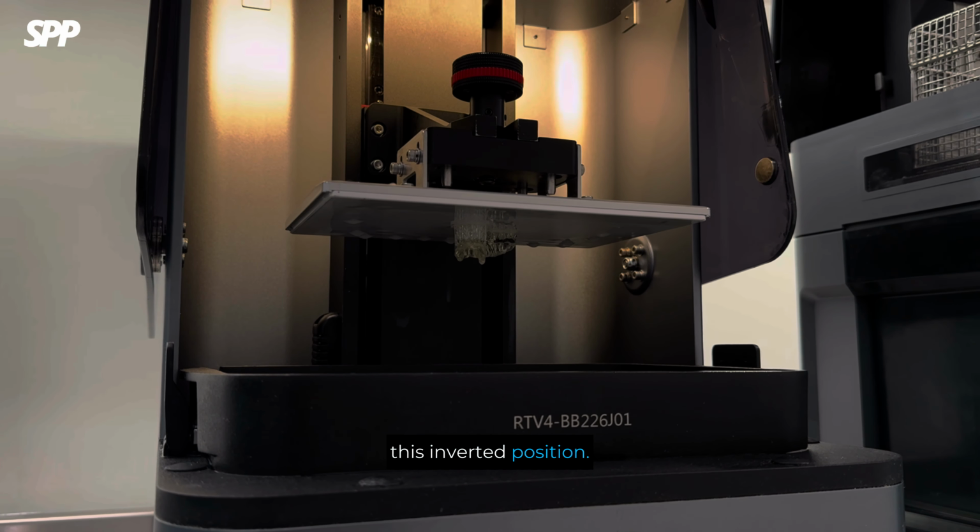The next step is washing. I move the build plate to the washer unit. This is a convenient unit that performs automatic cutting and cleaning. One advantage of this washer unit is that it can automatically separate the object from the build plate. This means I do not need to remove it manually. It helps keep the working environment clean.